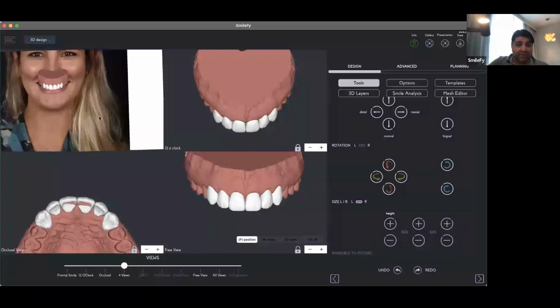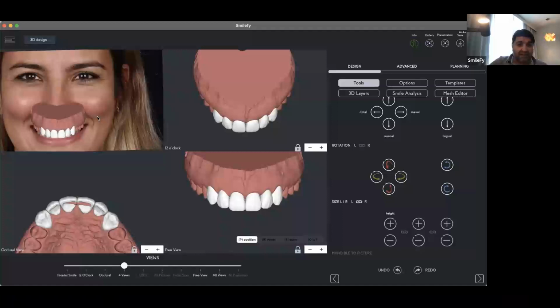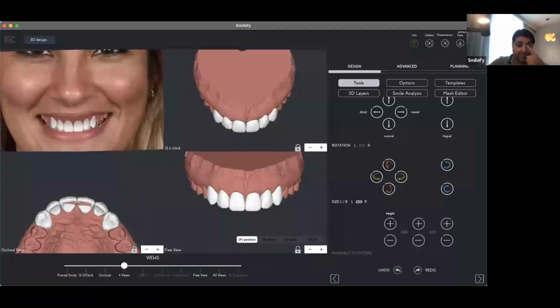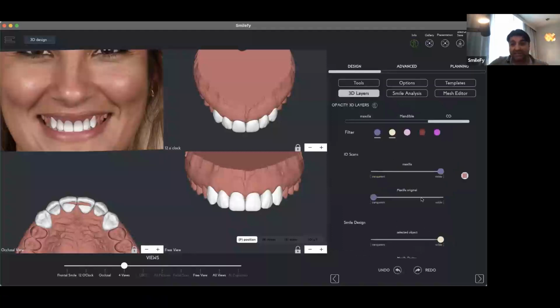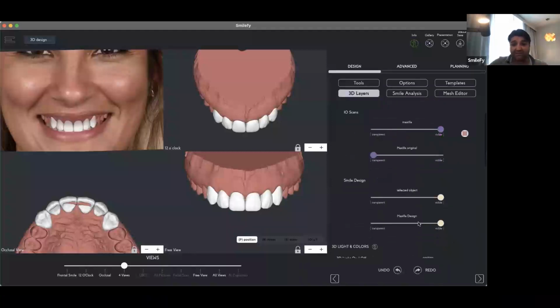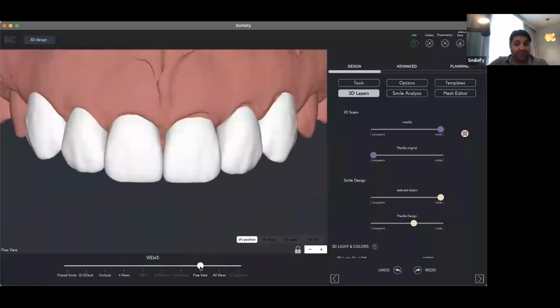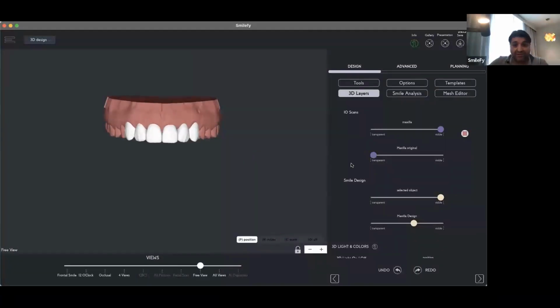And very important, let's put the smile in the mouth first to analyze the smile in the face. That's very, very important. It's a facially driven smile design. Now, we do have a huge, actually new incisal edge improvement, which is for sure too big, but that was caused by a very, very important analysis that we have done.